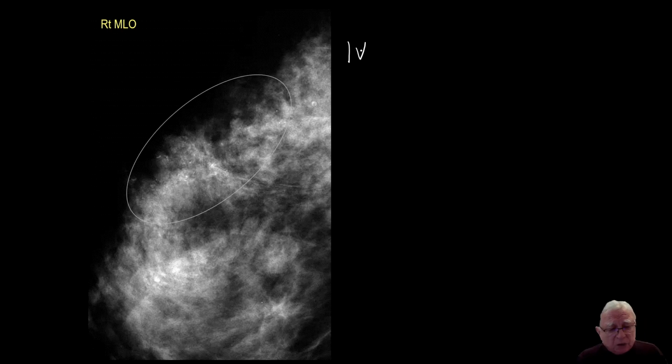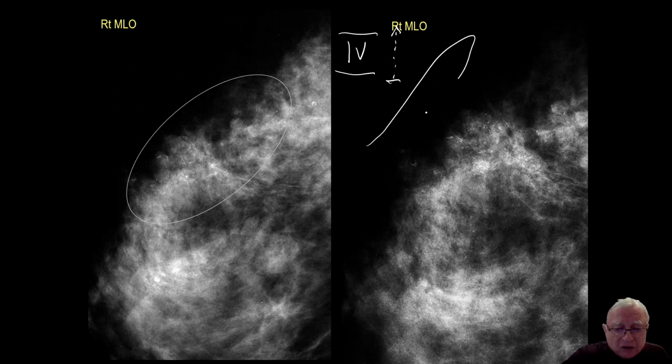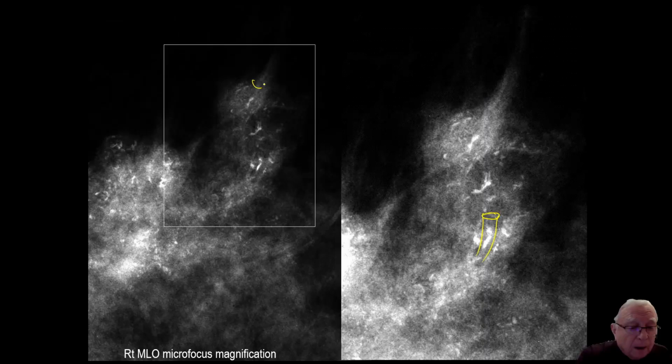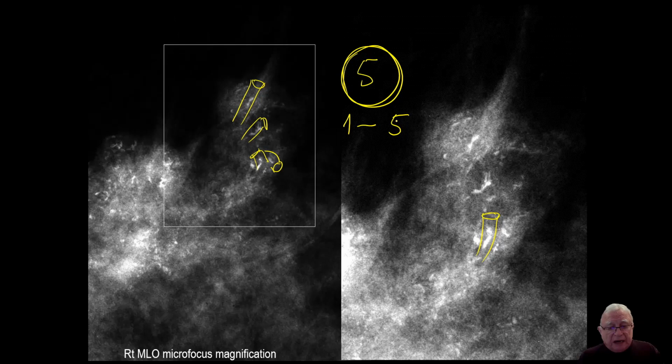This is the adenosis pattern, which is a high-risk pattern because the acini are longer. In those acini, there are many more cells, higher risk. Thinking about cancer, especially because of this. Localized to one lobe. They are localized in ducts. They are too close to each other. They are pointing in all different directions. These are malignant type calcifications. On a score scale between 1 and 5, this is super 5.